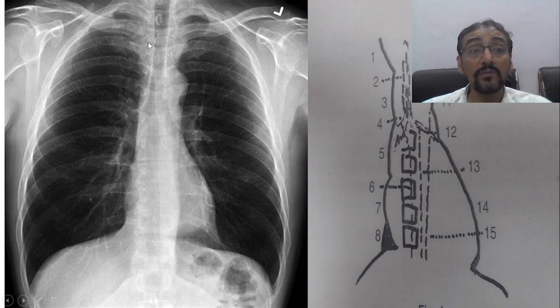नाउ दिस इज ओनली, वी हैव सीन सो मेनी थिंग्स आर देयर इन द एक्सरे, वी हैव ओनली सीन द मिडल बॉर्डर, दैट्स ऑल. हमने सिर्फ मिडल बॉर्डर में क्या क्या स्ट्रक्चर है वो देखा. सी, दिस इज क्लैविकल, वेरी क्लियरली विजिबल, एंड दिस इज द प्रॉक्सिमल पोर्शन ऑफ द ह्यूमरस, एंड देयर इज सम पोर्शन ऑफ द स्कैपुला इज ऑल्सो विजिबल. पीछे से स्कैपुला ऑन द बोथ साइड्स इफ यू सी, दिस इज द ह्यूमरस. ओके, दिस इज आपका क्लैविकल है, एंड दिस इज अ ह्यूमरस, एंड पीछे जो दिखाई पड़ता है दैट इज स्कैपुला, एंड दिस इज द मिड लाइन. वी हैव गॉट द ट्रेकिया के पीछे वी हैव गॉट द वर्टेब्रल बॉडीज. ओके, दैट इज वेरी क्लियरली विजिबल व्हेन यू गो डाउन. सो दिस इज वन पार्ट.